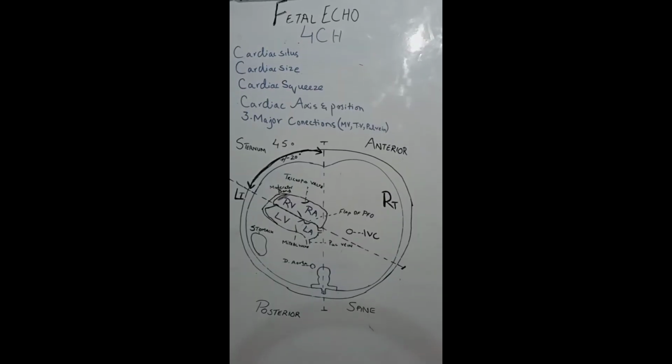On the four-chamber view, we can assess the pericardial effusion as well as pleural effusion. On color Doppler, we can assess pathologies which can be missed easily on the gray scale because the septum has depth, like VSDs, regurgitation, and stenosis. PRF should be high, like 50 centimeters per second.